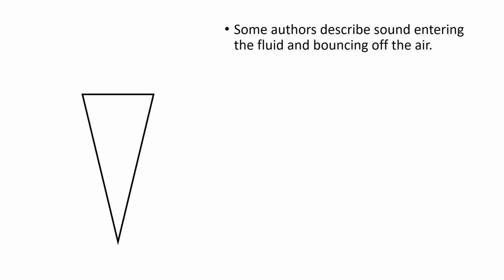So if this is my fluid droplet, kind of shaped like a horn, the ultrasound beam enters and then reverberates a whole bunch of times before it can escape. Some people think that's what produces the ring down artifact. What you're seeing is a whole bunch of little reverberation lines, much like a comet tail, just a whole lot more intense because it's inside a fluid droplet.